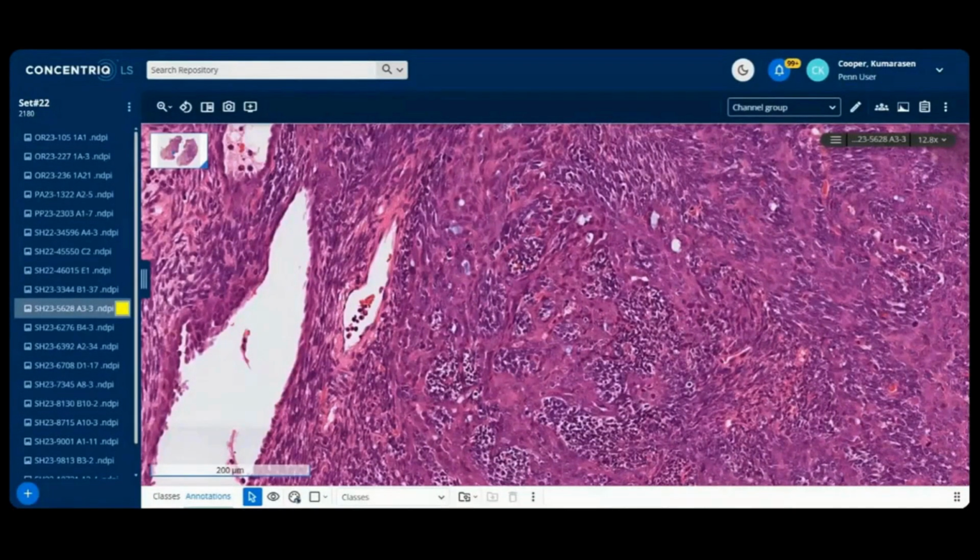Let's see. Sheena, squarely synovial sarcoma biphasic. Tom, vaguely adenosarcomatous, but let's go with biphasic synovial. Anastasia, cytokeratins, okay, that's cooking. Andy, biphasic synovial, admittedly areas resemble myxoid liposarcoma. Omar, S100, pankeratin, EMA.